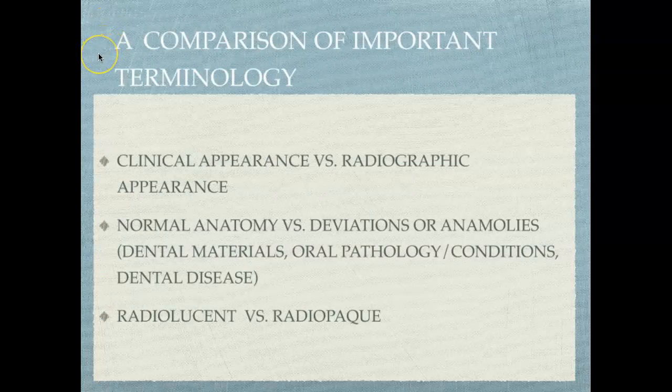First, let's look at a comparison of some important terminology when we're interpreting a radiographic image. We need to be able to determine the radiographic appearance of a clinical appearance. So that term clinical appearance means what we actually see in the mouth visually or perhaps on a photograph, an intraoral photo, versus what we see on a radiographic image, what the appearance is, and how those two actually relate.